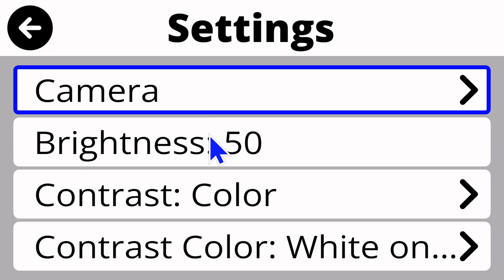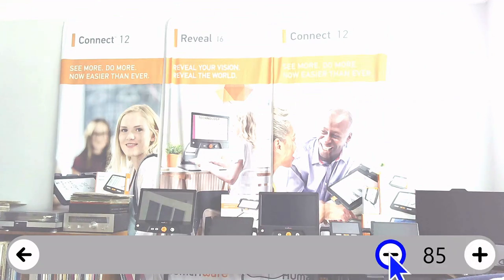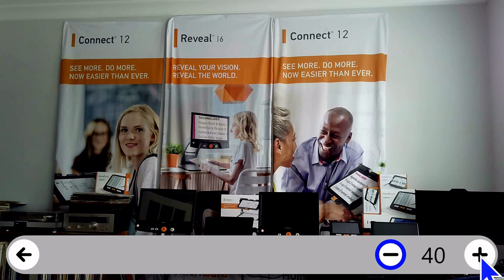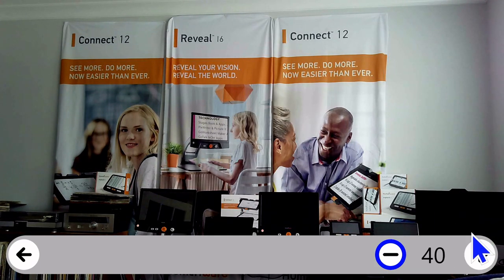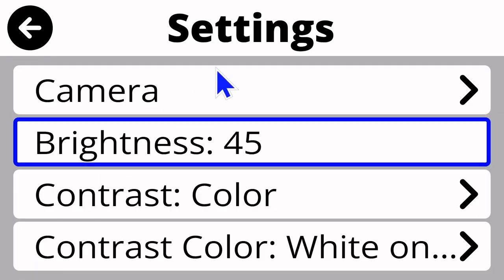Some other settings you have for the distance application. There is a brightness setting. So here I'll tap on it and you can see that it is increasing and decreasing the amount of light saturation for my camera. So the default is 50. Let's leave it on 45 for right now. And then I'll hit my back arrow. It will return me to my settings. I will cover what these contrasts are right now. So let's back out so you can see what that's all about.